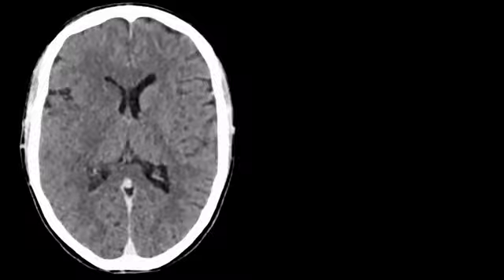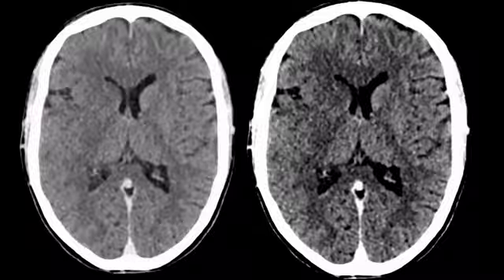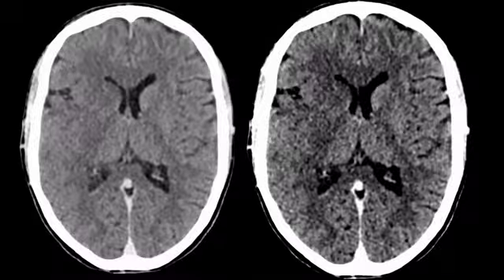The disappearing basal ganglia sign is a sign classically associated with a large vessel stroke of the middle cerebral artery and involves disappearance of the basal ganglia, because the lenticulostriate arteries arise immediately from the main trunk of the middle cerebral artery, and the lenticulostriate arteries supply the basal ganglia. The basal ganglia are extremely vulnerable to early ischemic infarction in case of a middle cerebral artery stroke.